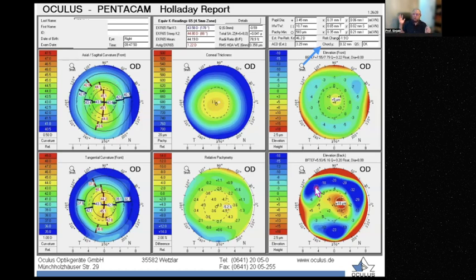And then in 2005, when I started having the Pentacam and so on, we could start understanding what's going on: the posterior surface, anterior surface, elevation maps. And I stopped doing anything without checking the posterior elevation map in both the best fit toric ellipsoid and best fit sphere.